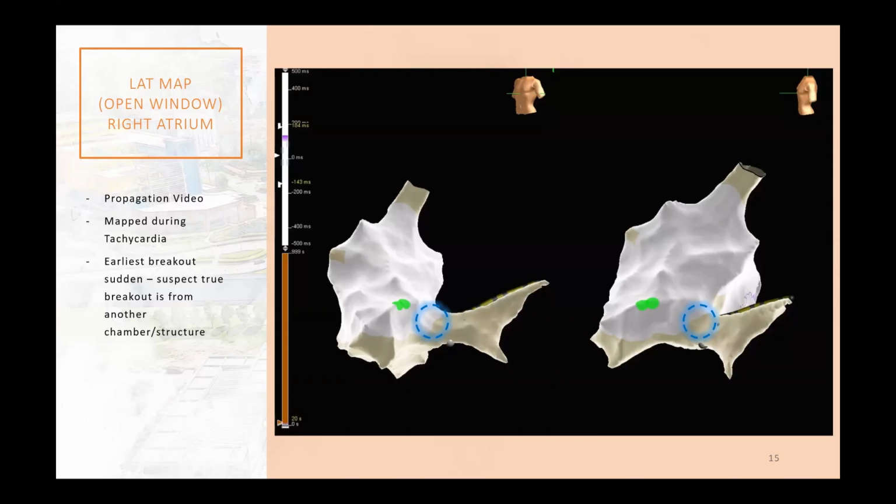Okay? So you're going to have to find the biggest pathway potential, which site, and then you have a sharper signal, then that's what you're going to target. Now, we still believe if you're going to burn posterior to the MCV aspect, you better do angiography, right coronary angiography, to look at the posterolateral branch. Not safe otherwise. Okay? That is the answer.